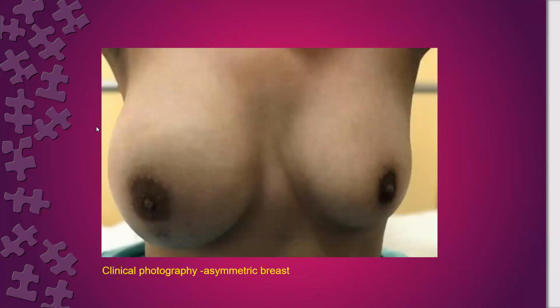The role usually is ultrasound. And what about this case? Also, she looks young. Look at her breast, the left breast is not pendulous, but she has asymmetry. What do you think? Unilateral macromastia. We agreed that we have to exclude first. Is she lactating? No, she's not married. What is the differential diagnosis?